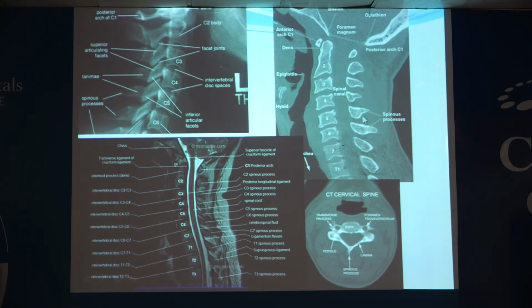This is a CT bone window imaging. You can see the spinal cord, cervical spinal.